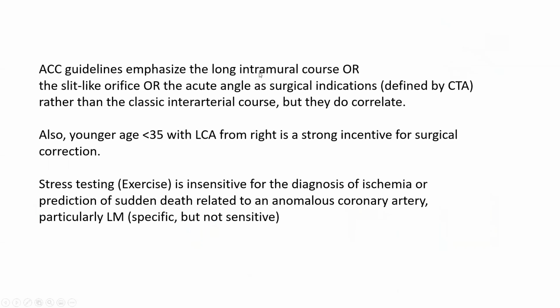ACC guidelines emphasize the long intramural course, the slit-like orifice, or the acute kinked angle as surgical indications defined by CTA, rather than the classic interarterial course. But again, for the longest time, interarterial course has been the malignant one and has been correlated with sudden death on autopsy studies, and it correlates with those anatomical features. Also, young age is insisted upon in the guidelines for surgical correction.